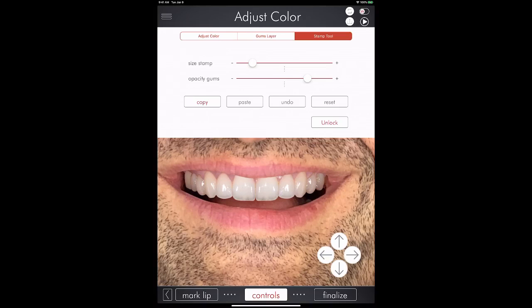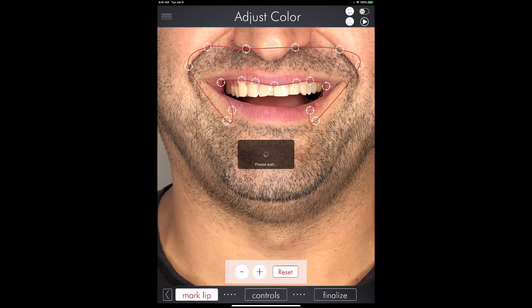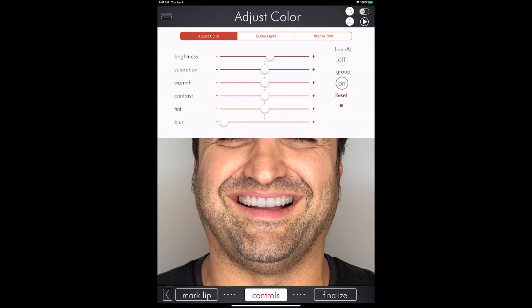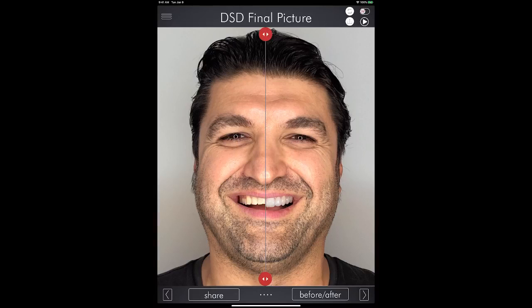As you can see, maybe we bring the centrals a little bit more like this. Let's see. And here we go. I think this design is good. I discussed with my patient, that's myself right now, my smile design. So, Ron, George, do you need your smile design?